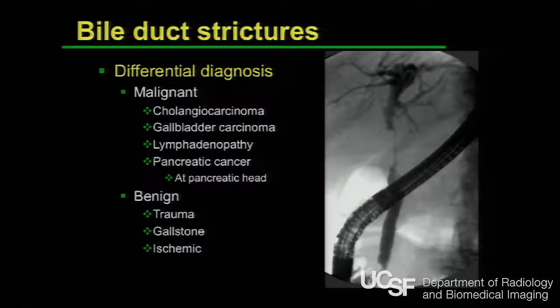We're a little bit better with bile duct strictures because it obstructs the bile ducts, and the patients get jaundice symptoms earlier on. And we look for malignant features of the bile duct stricture, including abrupt shouldering, eccentric narrowing of the bile duct, longer segment involvement. Those are all typical of malignant features, and they may be cholangiocarcinomas.